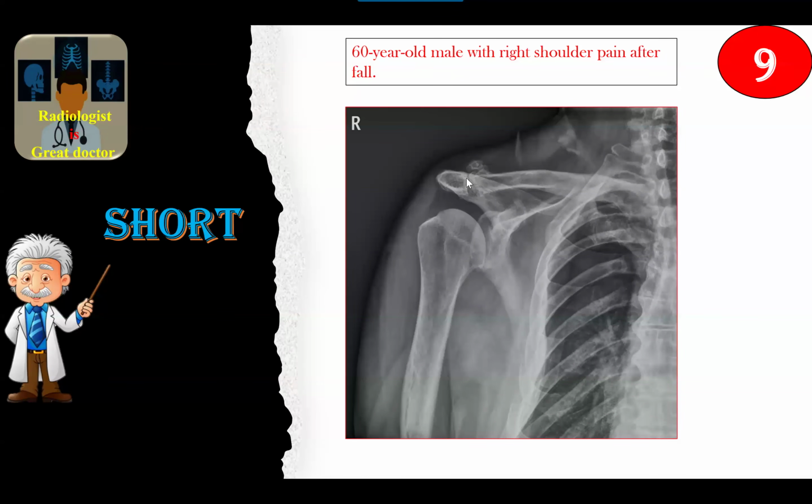The rest is normal except for some osteoarthritis and some calcification. I will urgently pick up the phone and refer the patient to the emergency physician for chest tube placement for pneumothorax. Then, in management, I would also do a formal chest radiograph to look for the rib fractures and the other shoulder.